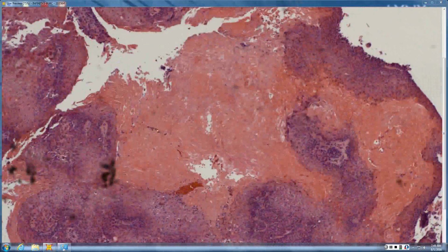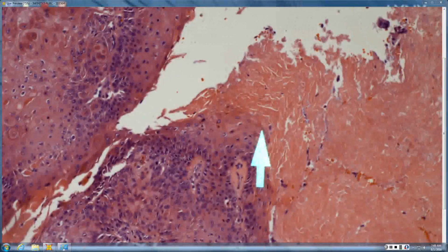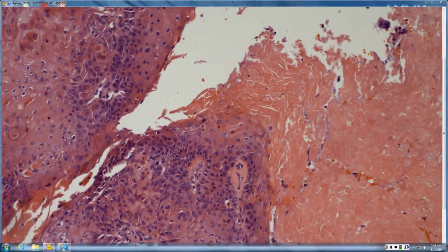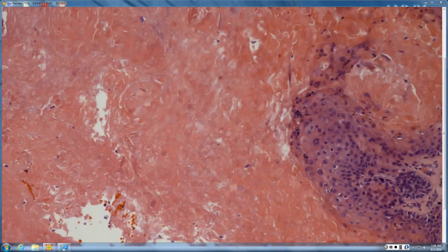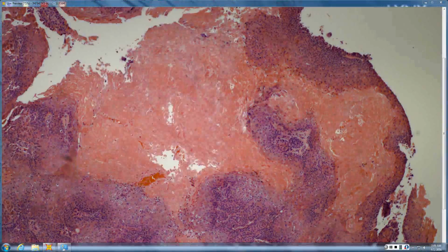What kind of keratinization does it have? Is it keratinizing with the granular layer, or is it keratinizing kind of abruptly without flattening first? Pretty abruptly. So what you might call a tricholemmal keratinization.